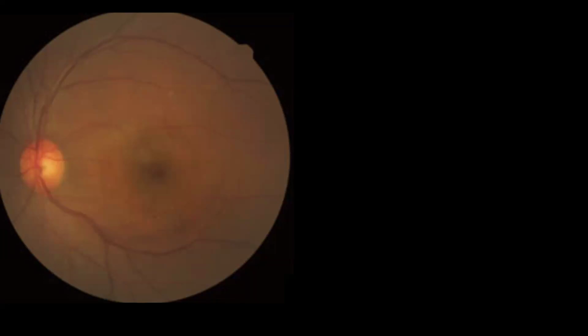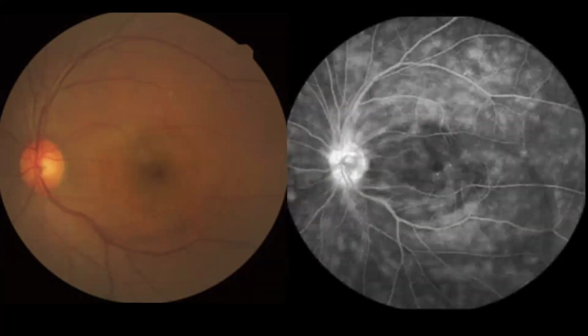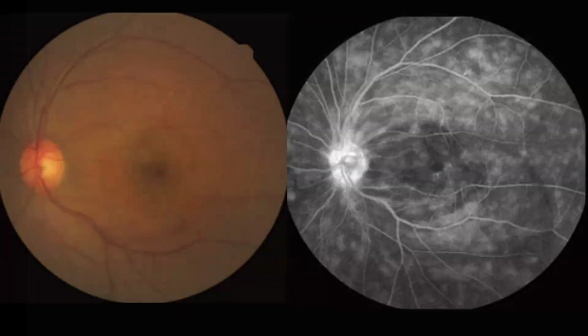So essentially, if you were to have faced this patient, you would really think nothing much of the retina. It's really unremarkable. But if we do an FA, we suddenly find a lot more findings revealed. So definitely that is not a normal angiogram. Later we'll discuss the features that are shown there. So just to drive the point, FA can reveal abnormalities even when you don't see anything apparent just by looking at the eye.